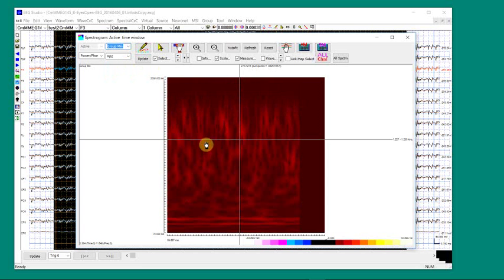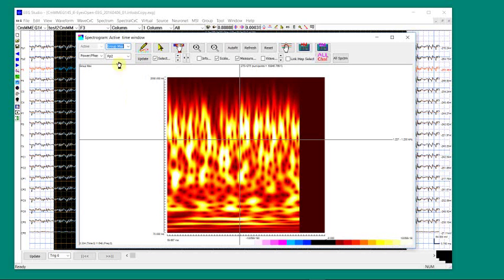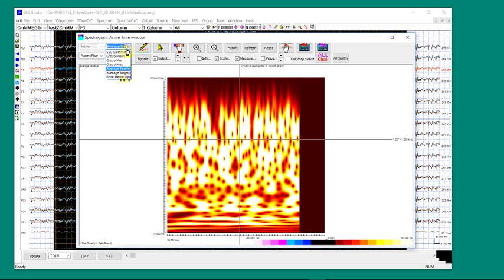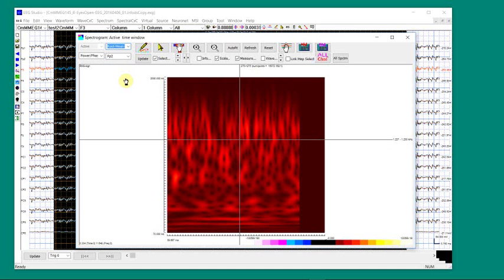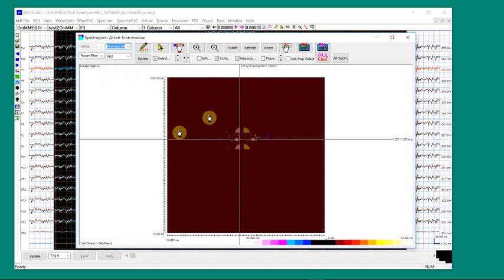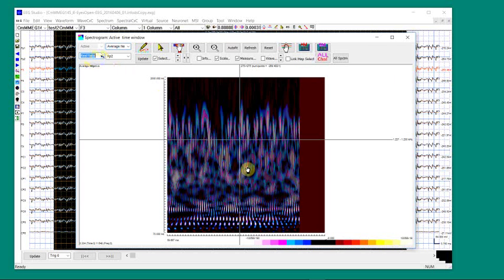This is group minimum, group maximum, the average positive, average negative, and the root mean square. Of course, the negative is almost zero, but if we use real data, it should have something.